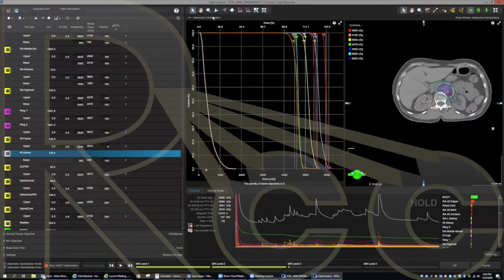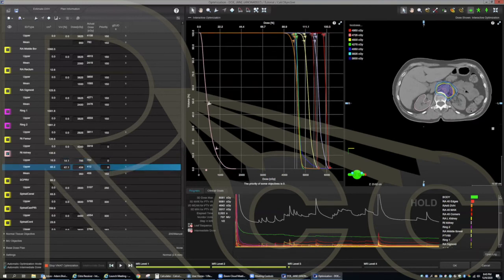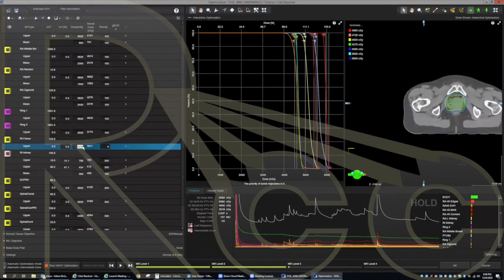So here's my right kidney, and I'm just going to put these locking structures on here. I'll put 2 points per structure, not pushing it, but just locking them in place. I'll put them at priority of 300. So I'm not pushing anymore. It's not doing anything. It's just not going to let it move. These femurs, sorry, I even forgot to put anything on them. Again, my ring sort of did that trick anyway.